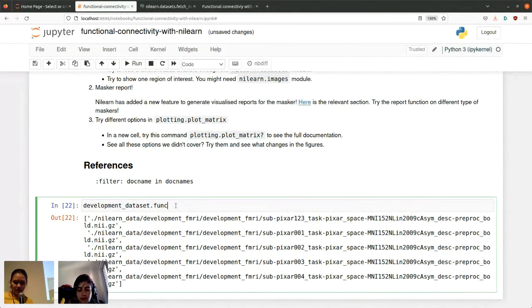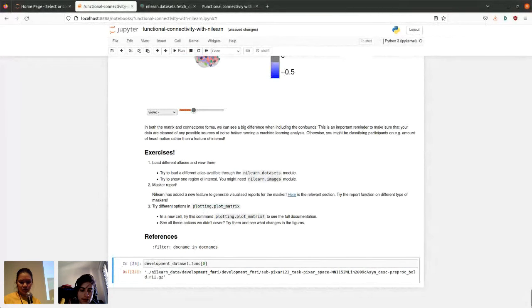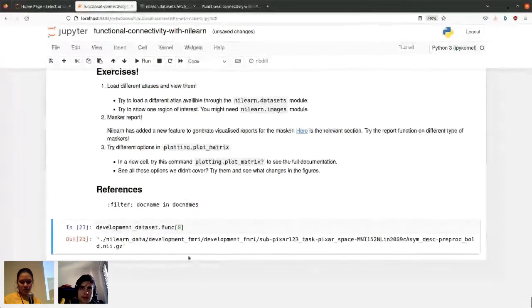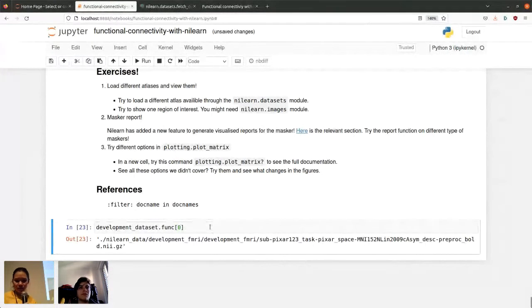And basically, what I showed in the analysis when I was inputting this data and using just one subject, you can just index it and then work with data of this one participant. I hope that's enough, but if you have a follow-up on that.